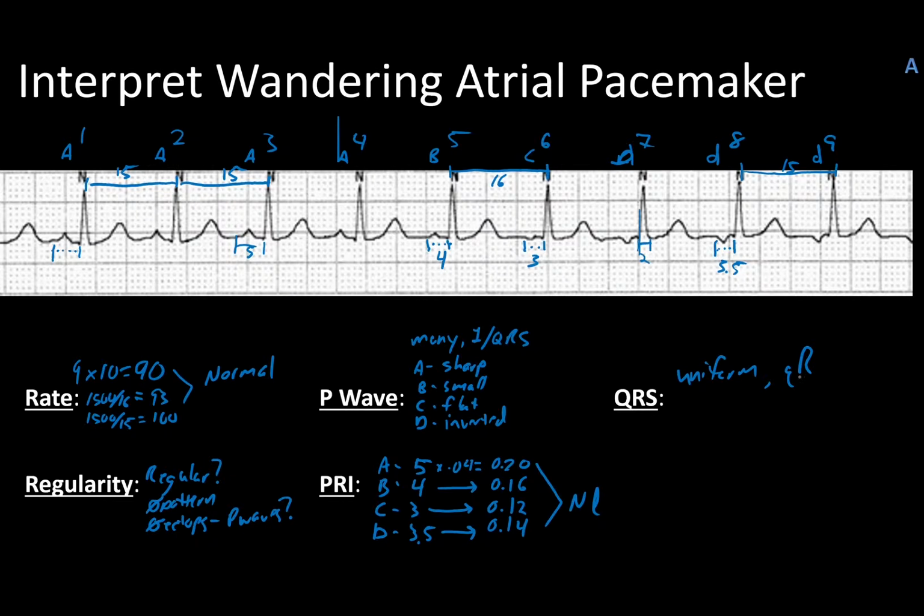And that's a 2. So that is, oh, there's no ectopies. So that gives us wandering atrial pacemaker.